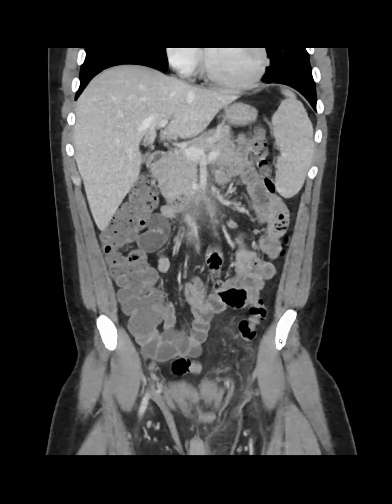So one of the things that is very uncommon is metastasis to the gallbladder. Melanoma somewhere, Victoria. Yeah. So this is a horrible case of melanoma, which you can see has peritoneal mets, it has MSK mets right there, adrenal mets, and then a very unusual gallbladder met.